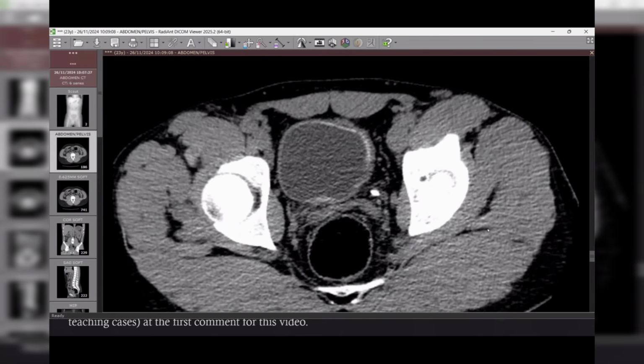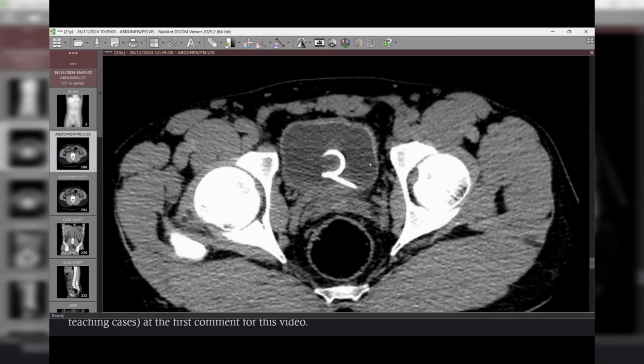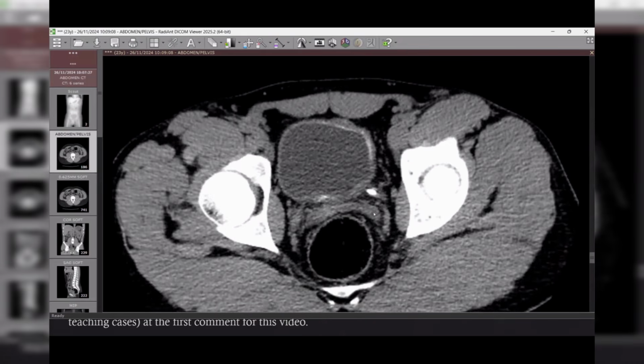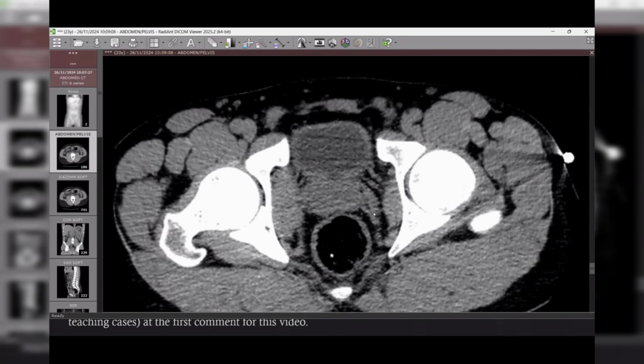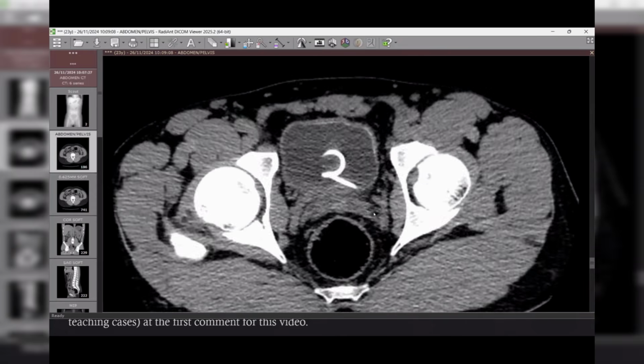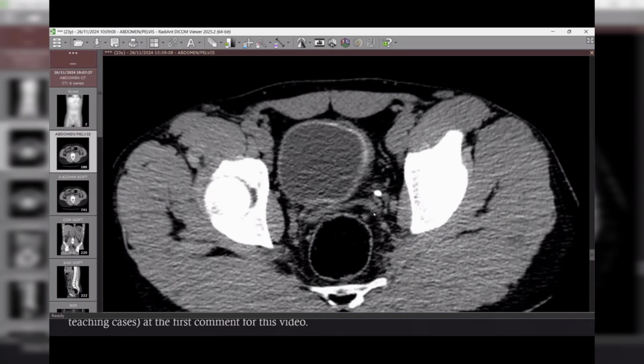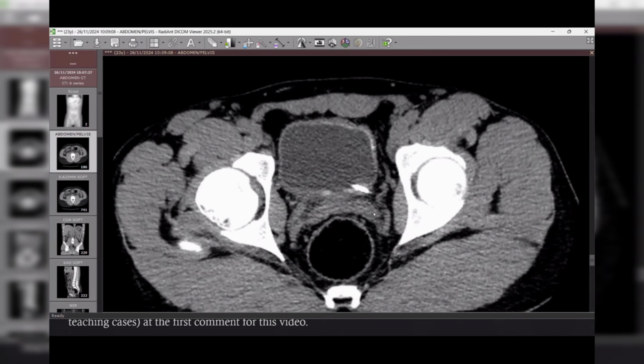Why did you say the most likely diagnosis is bilharzial? Is there any other differential diagnosis for these calcifications? Chronic cystitis can also cause such calcification. And another possibility is chronic infection, as the patient also has a history of dysuria. Bilharzial is one of the top differentials. The second differential is chronic UTI; these infections can cause chronic cystitis.